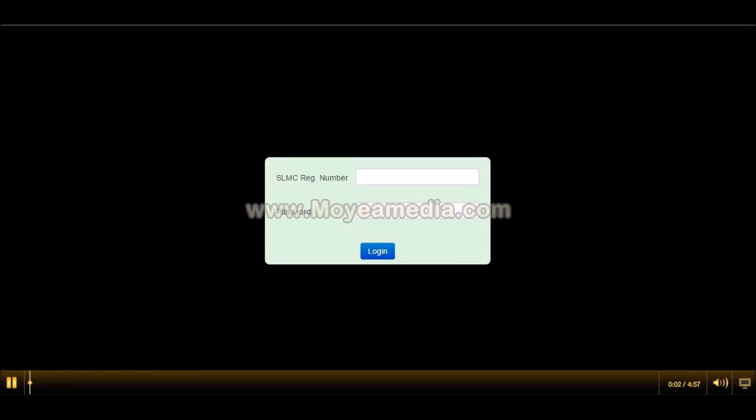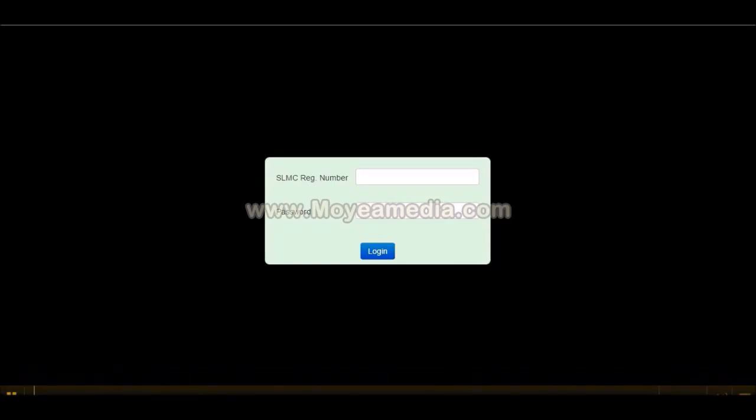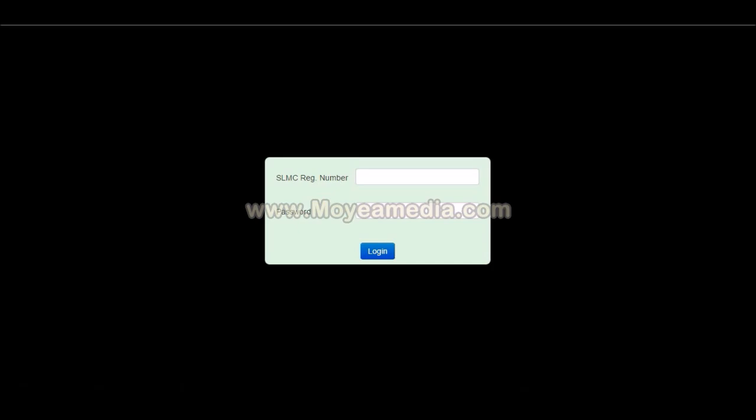This is the user guide provided for the iBlood system. This video will provide information on how the doctors should use this solution. This is the initial screen of the iBlood solution.